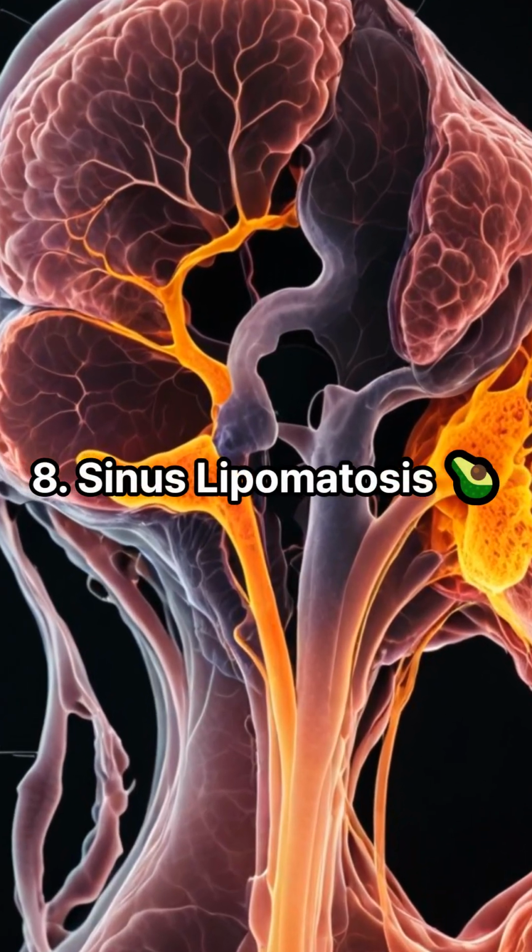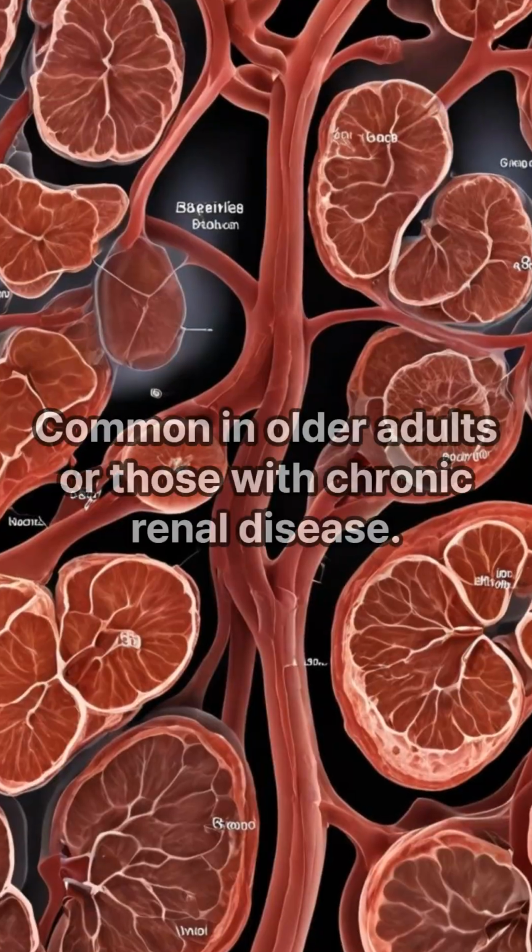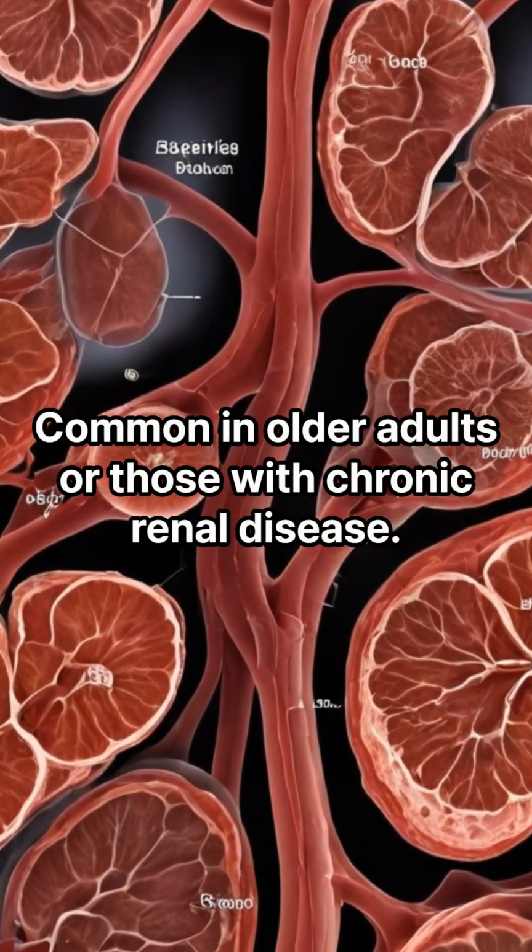8. Renal sinus lipomatosis. What is it? Increased fat deposition in the renal sinus. Common in older adults or those with chronic renal disease.